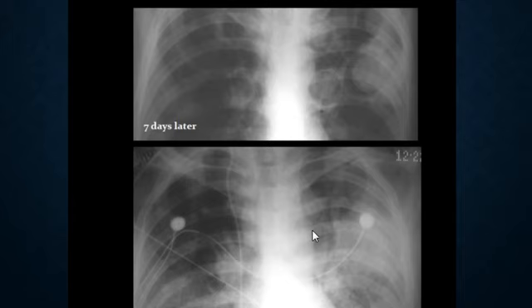Another example, you can see it in chest x-rays. Here it's just an area of airspace opacification, maybe ill-defined. There is some linear thing here, not quite sure whether it is there or not. A week later, you can obviously see that this is a very well seen crescent sign. It's a crescent surrounding the fungus ball, indicating a mycetoma, okay?